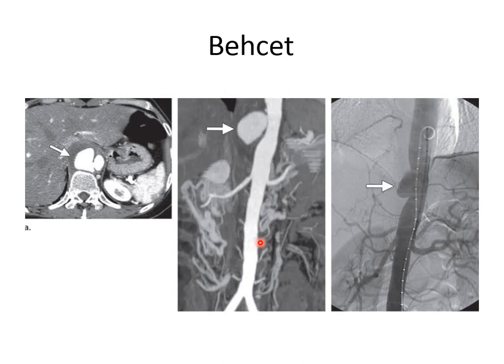So here we can see CT angio, saccular aneurysm, causing pressure on the true lumen of the abdominal aorta and thickening of the wall. This is axial and this is the sagittal. We can see the saccular aneurysm and narrowing of the wall. This is not sagittal, this is MIP coronal, maximum intensity projection coronal reconstruction. And this is conventional angio, showing us the aneurysm and the narrowing of the wall.